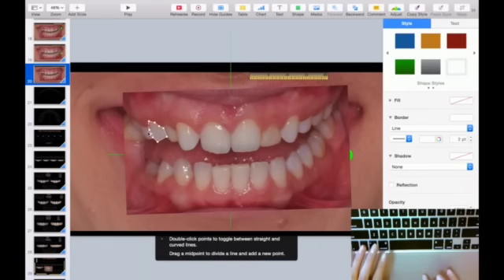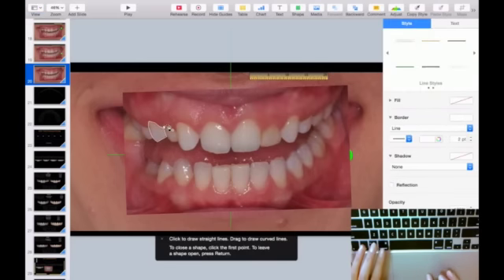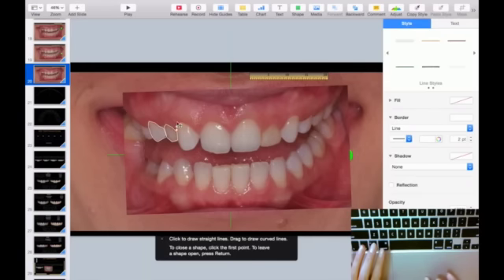If you want to make this a little curve, you can get the little dots here and curve the lines, okay? And you do this with all the teeth that you're gonna reposition or extract, or whatever all the specialists decide they should do for best results and respecting the function and biological space of each patient.